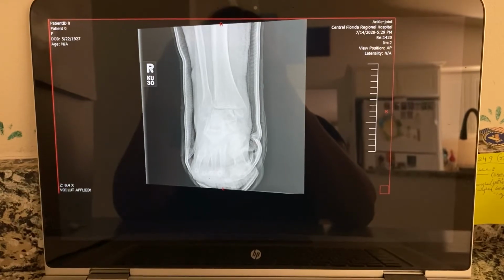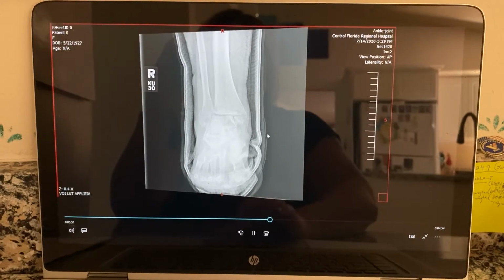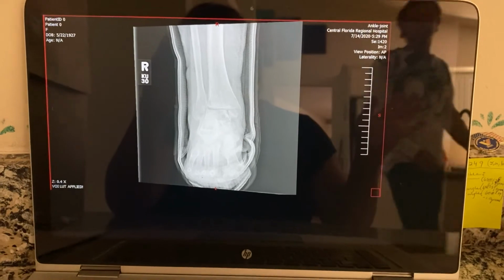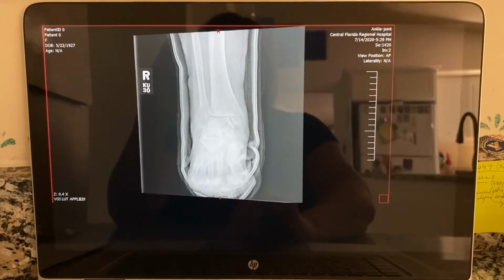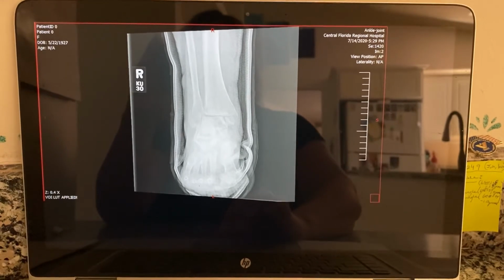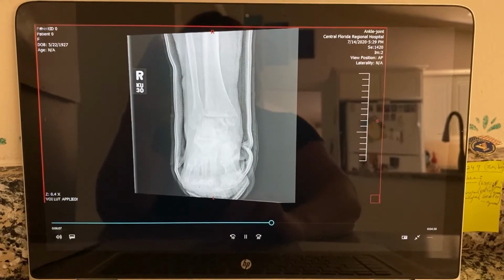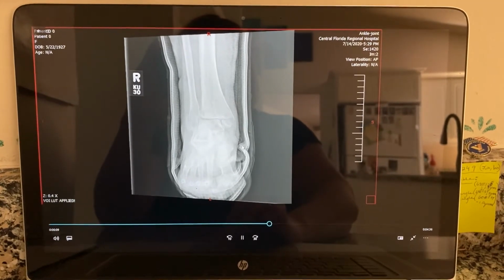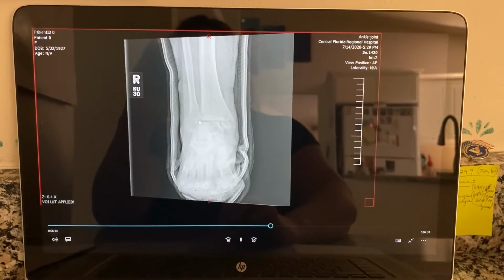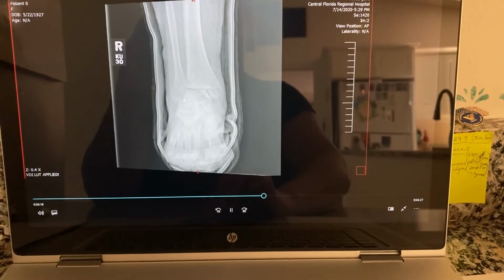Her cast would require an increase, and I believe this image is slightly underpenetrated. Images were of diagnostic quality. However, the patient was unable to obtain a 15 to 20 degree medially rotated position with her toes pointed straight up and plantar surface exactly vertical. So a tube angle of 30 degrees was applied, causing slight distortion and partially opening up the joint, particularly on the lateral side.